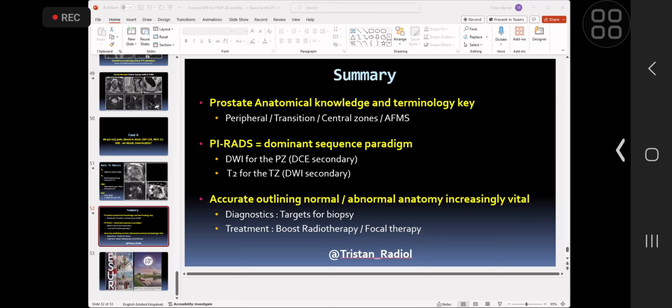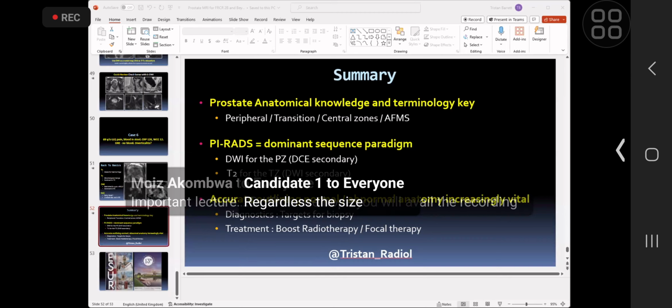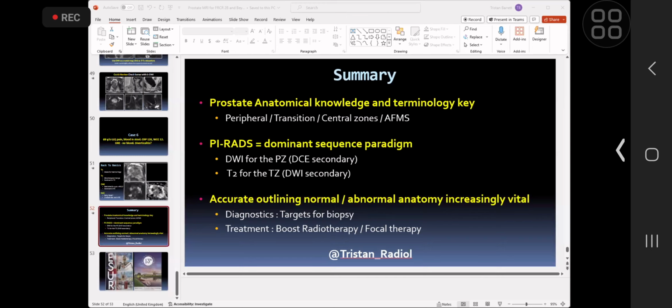I think there was some question about the lymph nodes. The B-value imaging can act as a nice nodal map, but don't rely on the fact that there might or might not be restricted diffusion. You can't rely on that. You can use the B-value imaging to identify the nodes, and they do have high T2 signals. So part of that is a T2 shine-through effect, but restricted diffusion doesn't reliably tell you that nodes are involved. We still have to rely on the morphology of the nodes, the size, the shape, fatty hilum, irregular, rounded, short axis diameter. So those are the things that you particularly pay attention to.